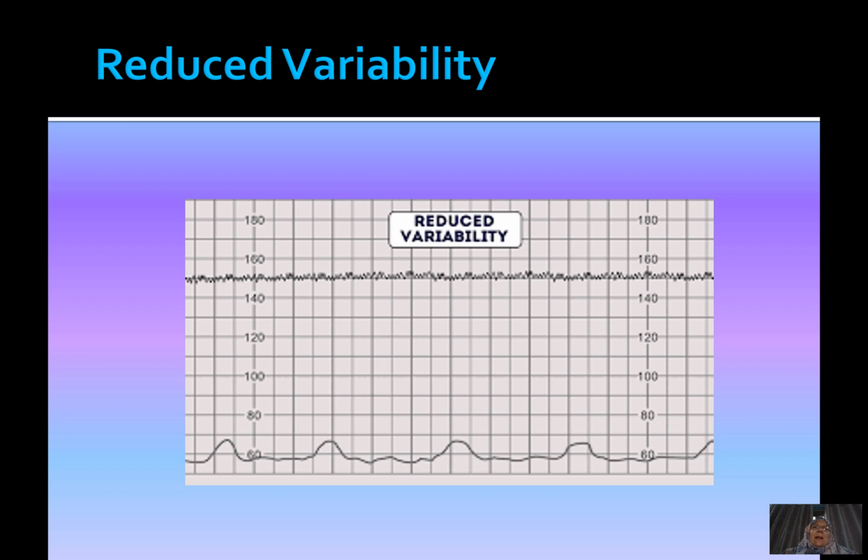As a comparison, I want to show you this picture that illustrates reduced variability. Again, you see a patient who has about 3 contractions in 10 minutes, or tightenings. We are unable to say. Sometimes you see such little changes on the CTG, and they represent tightenings. But they might also represent contractions, and that is if they are painful and if they also put the patient into labor, so cause dilatation of the cervix.